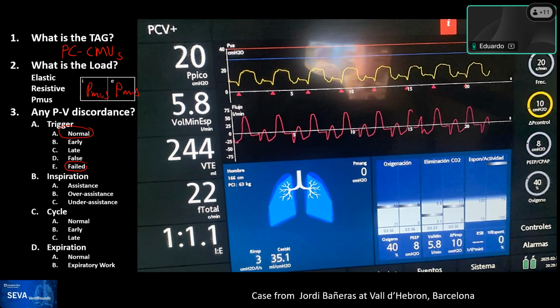The second one that you see is how the flow crosses from expiration to inspiration. So it all looks true, and so the ventilator is pressurizing immediately. So I think that you're absolutely right. This is a normal breath.